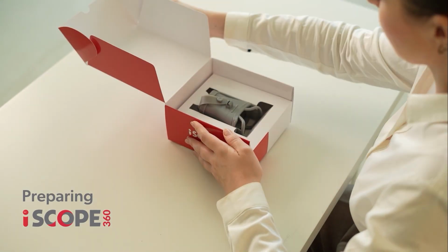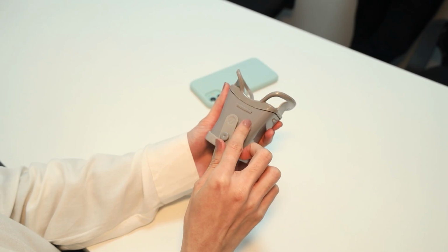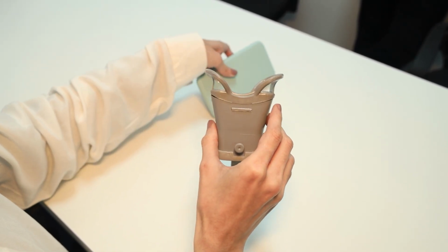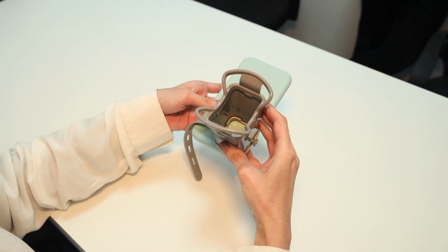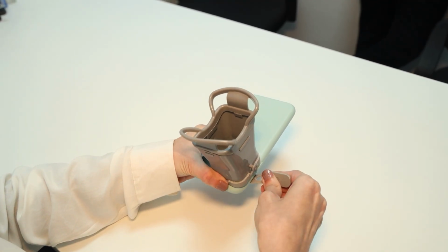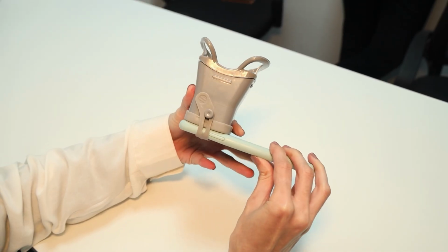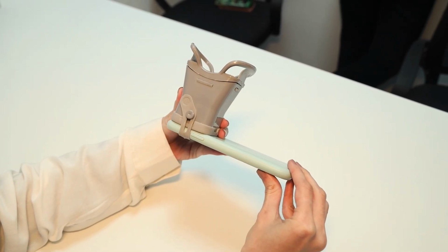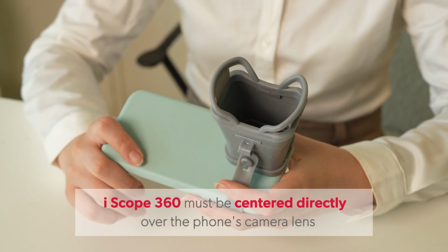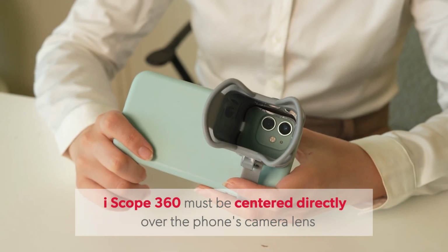First, we'll prepare the Scope360. Open the elastic straps on the Scope360. Now, carefully slide it over the phone's rear camera, aligning the Scope360 lens directly with the phone's camera lens. Once aligned, secure the elastic straps firmly so that Scope360 feels stable. Scope360 must be centered directly over the phone's camera lens. Any shift in position may affect scan quality.